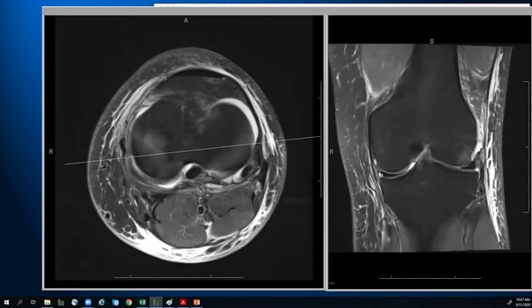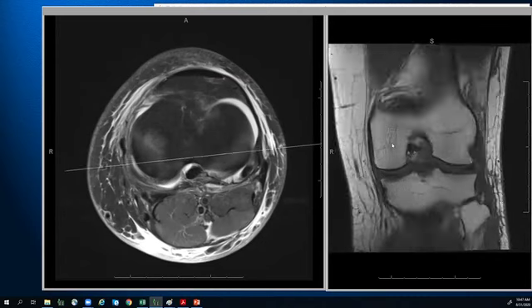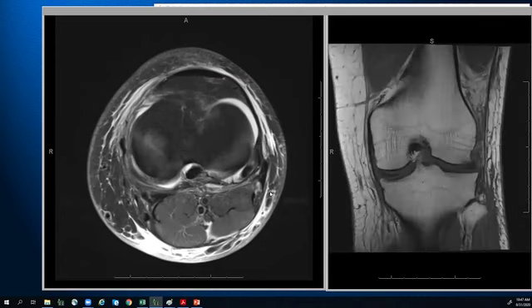So when you wind up with these thin slivers of meniscus, that's how you can miss a vertical tear. Sometimes it helps to look at a proton density or T1 sequence to help figure things out, or sometimes it helps to combine that axial plane to see that linear signal abnormality that's paralleling the course of the meniscus. So hopefully that makes sense.